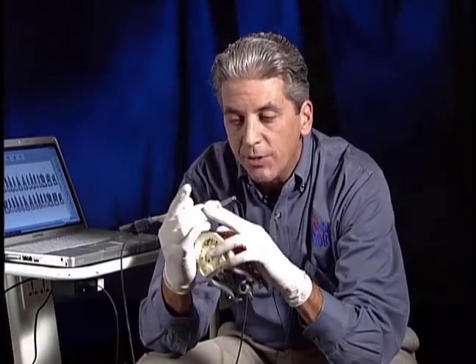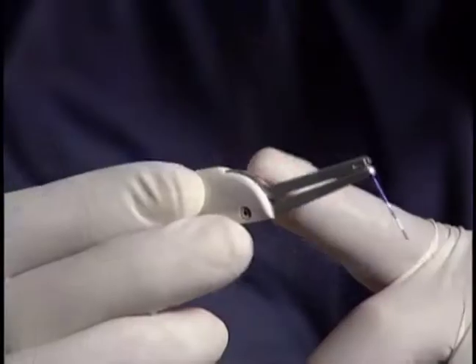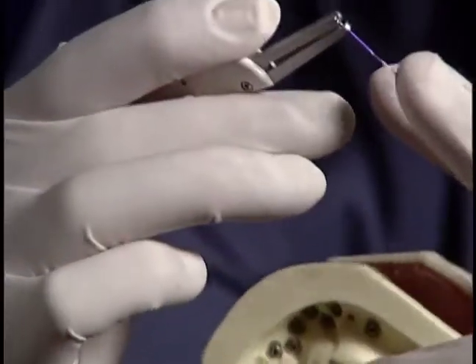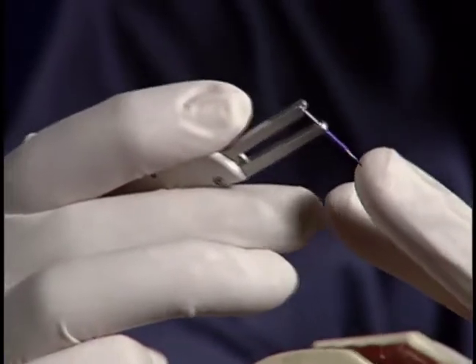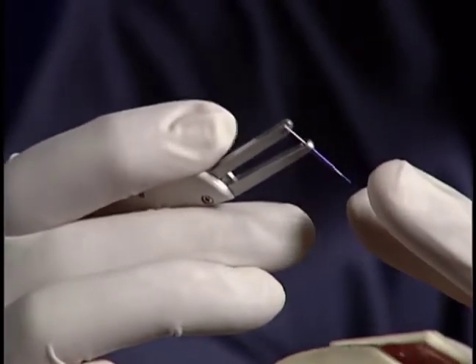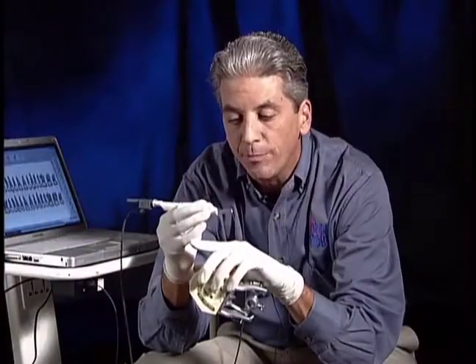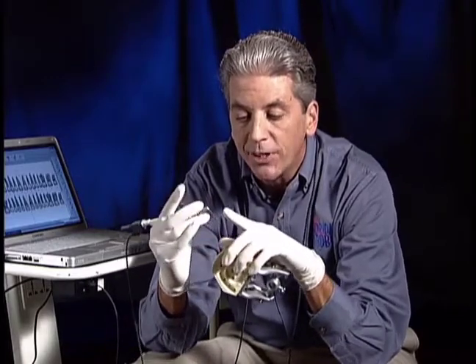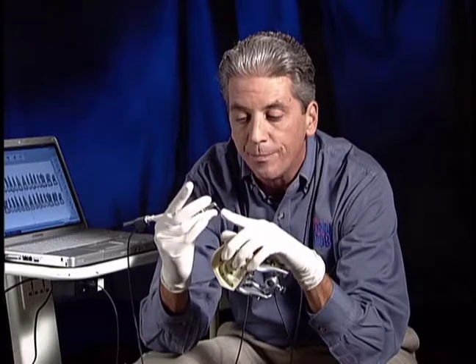Small thing, but even a gloved finger on this rounded portion can create enough friction to interfere with the 15 grams. I want to hold it far enough forward to fulcrum, but I don't want to rest on the blue button nor interfere with the travel of the silver arm.